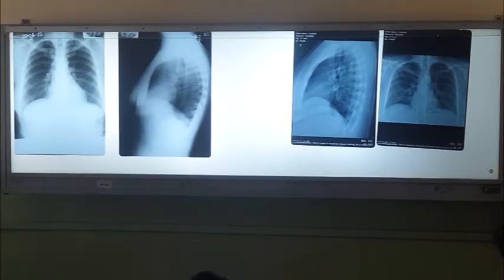And if they say abscess, there is a cavity with a fluid level. And if they say cavity, it is without any fluid level. So abscess means cavity with a fluid level. If they say miliary, there are 2 millimeter widespread shadows, all less than that. So that is miliary. If they say honeycombing, there is a honeycombing appearance. So the description is there. So use these terms to describe the X-rays, right?